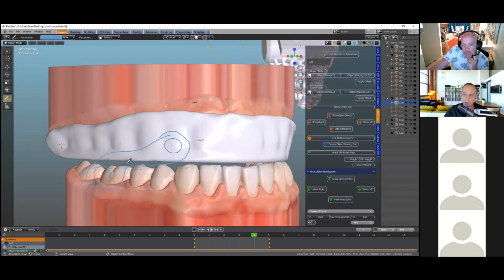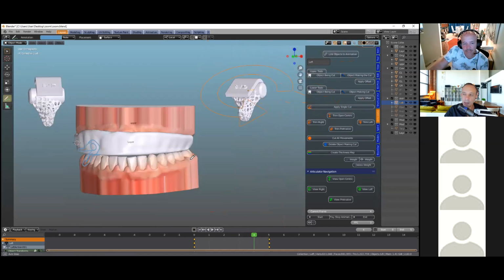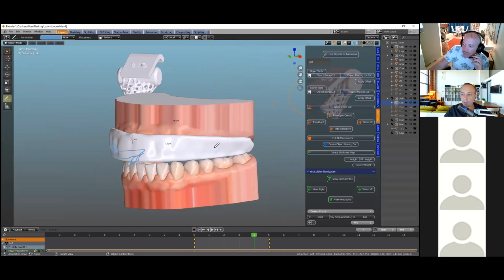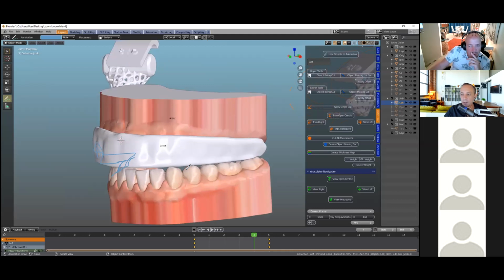It's fairly simple to do. Would you make a union of that, or what would you recommend? Well, no, you don't really need to unify things. You can just keep it as a separate object for 3D printers. Look at the layer as its own, then make the Boolean cut and just put the attachment on as a separate object.